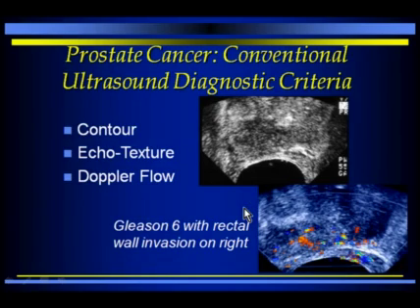Okay, so we talked just for a couple minutes on prostatitis. Perhaps the more important or more common reason for doing prostate ultrasound is prostate cancer. And here it's usually being done because there was an abnormal rectal examination or because there was some type of abnormality on a PSA blood test. What does prostate cancer look like?